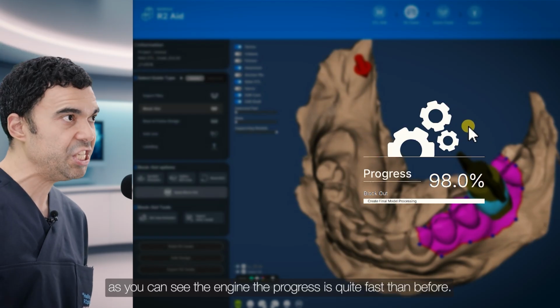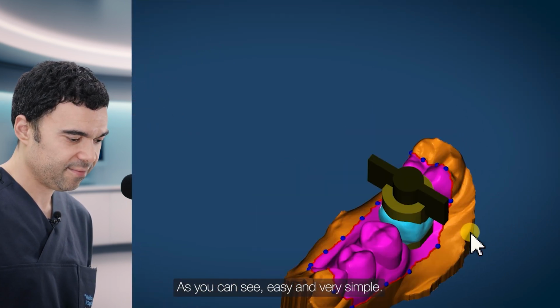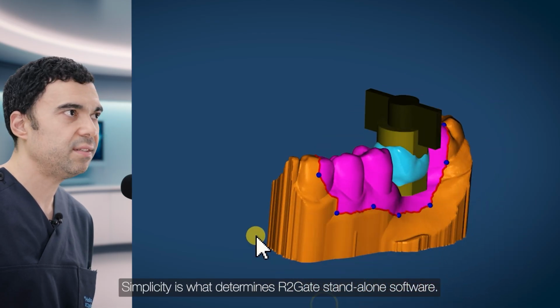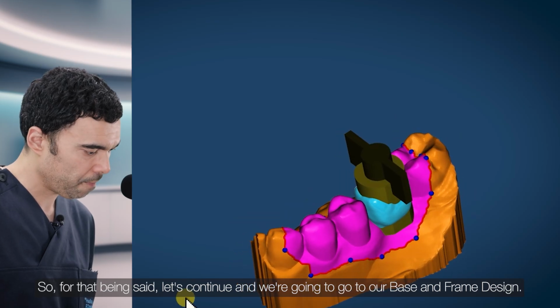As you can see, the progress is quite fast compared to before. As you can see, easy and very simple. Simplicity is what determines R2GATE standalone software. So, for that being said, let's continue.